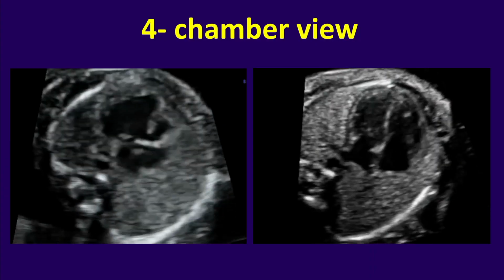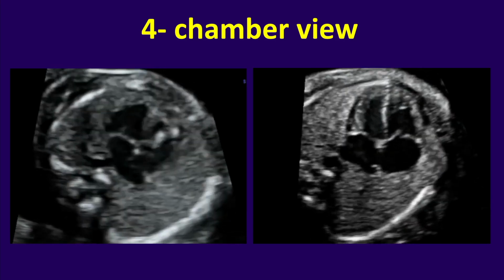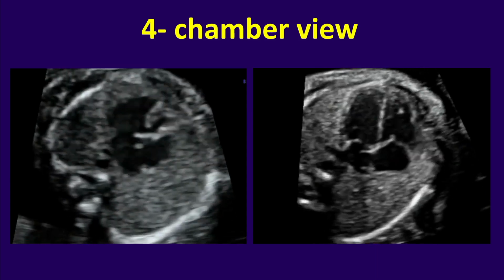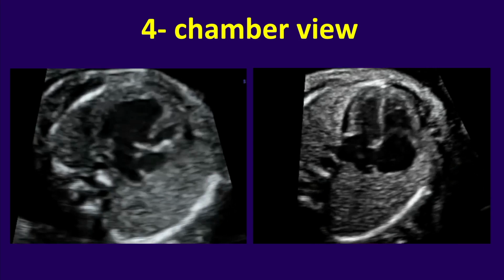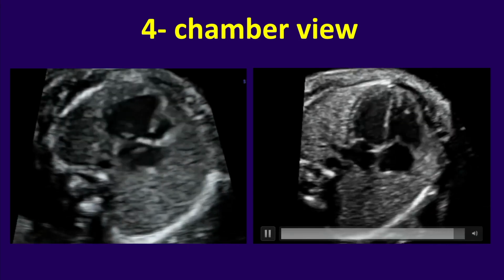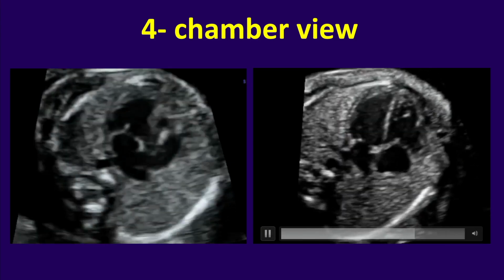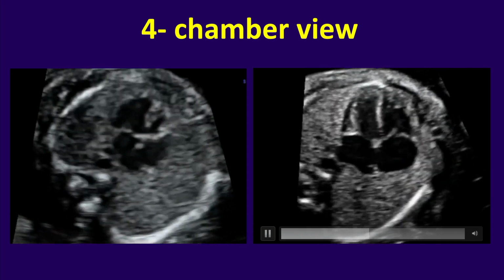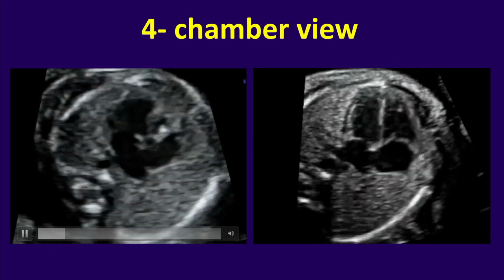So, we are moving to another case and another pathology that affects the right side of the heart. Now I would like to ask the question: which heart do you want to be, the one on the left or the one on the right? Right? So this is pretty much what you need to do. You look at the four-chamber view, and it's pretty obvious that you don't want to be the one on the left, right? So you need to have this reference image kind of imprinted in your head, and you will compare anything that you see in the four-chamber view, like here.